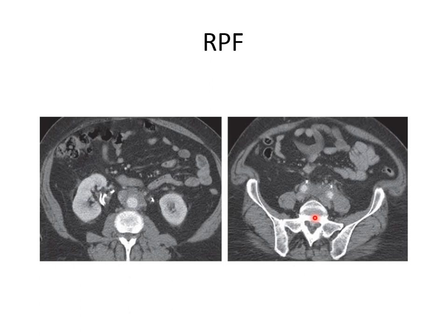It causes the ureters to deviate towards the midline. Yes, displacement to the midline. Displacement means lateral. Mass effect means pushing. It is not mass effect, it's pulling. Okay, that's typical for retroperitoneal fibrosis. You see the ureters deviate medially instead of laterally.